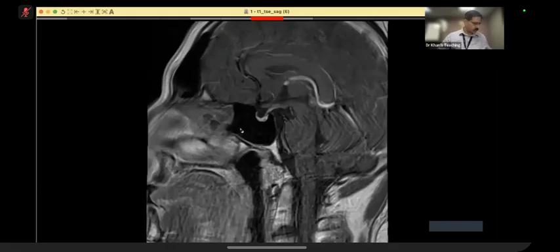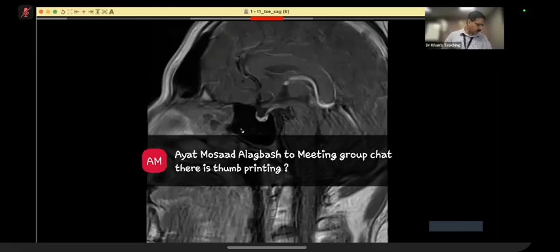Candidate 6, are you with us? Yes, I'm there. Okay, so this is a case of a 24-year-old patient presented with polyuria. They have said hypothalamic dysfunction, question mark, polyuria. They have asked for MR of the pituitary. Over to you.